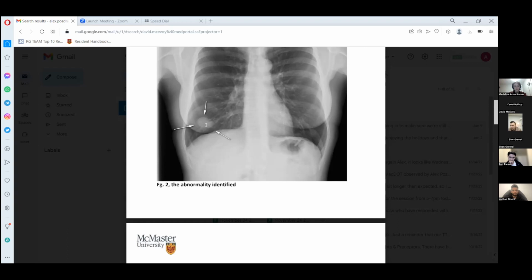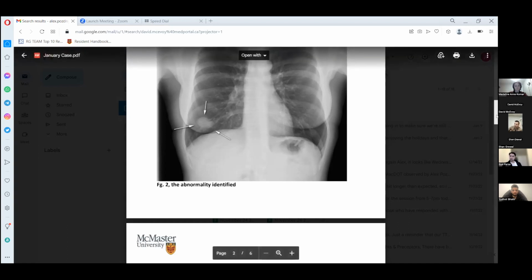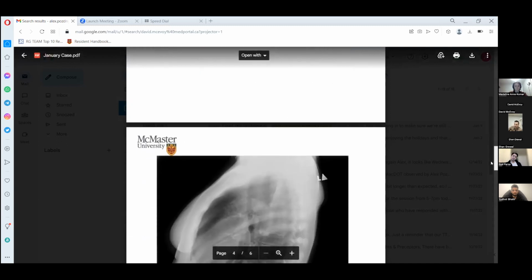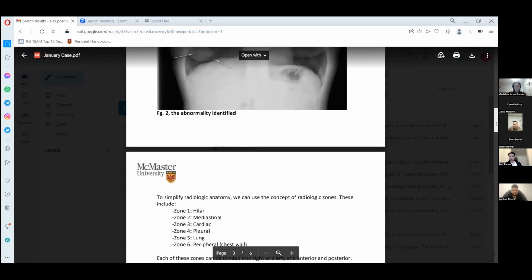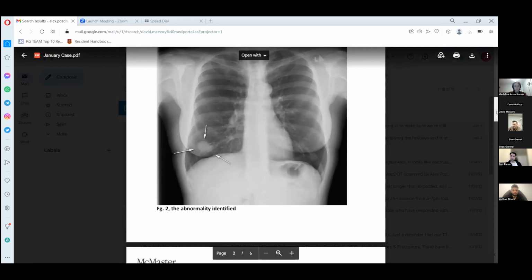But other things that you could potentially consider: pneumonia, as we talked about, would be a little bit more hazy, but still could be, especially in pediatrics, where you can have very round, pseudotumor-like, mass-like lesions in children, and pneumonias in children can look like this. Also, you can have not necessarily cancer, but a benign lesion in a lung. You can also have an arteriovenous malformation, which is along the lines of a vascular malformation. You can always think about those.